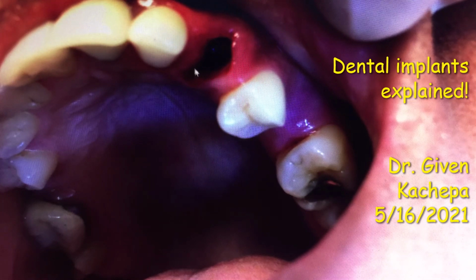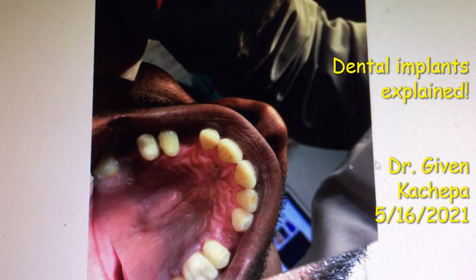So the implant is just a thing that goes inside of the osteotomy here, and this patient was a good candidate for that because their health was good. They are not a smoker, they don't drink, because if you do all of those things, then the likelihood that this implant is going to be a success is very, very small. So we have to make sure that we're checking for those things before we do an implant.